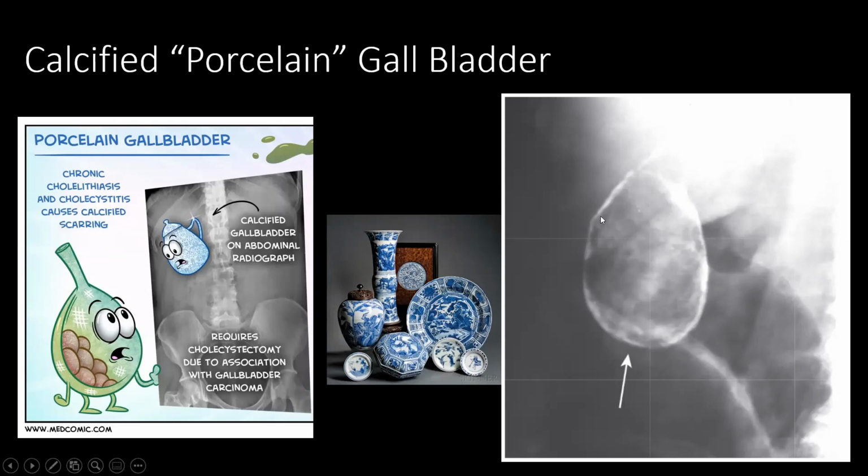Now, there is an important thing to know. When I have a tube, like the gallbladder, or for example the arteries, the calcification pattern is linear. So as you can see here, it's a linear calcification along the wall of this gallbladder. Okay, so this is porcelain gallbladder indicating recurrent cholecystitis.